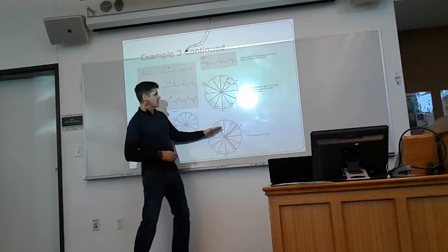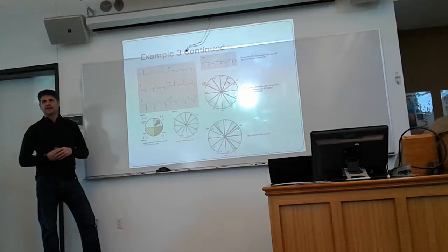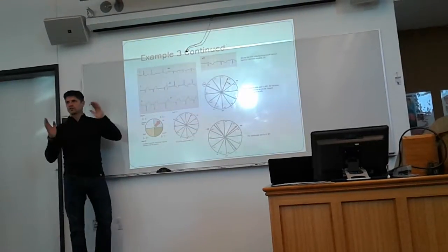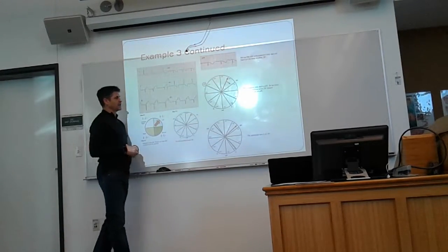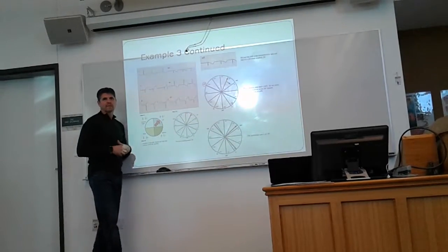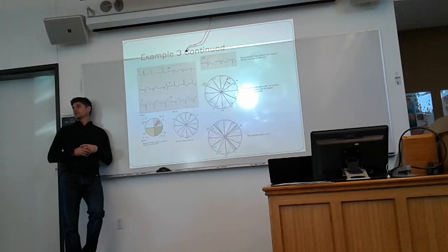Granted, if we start shifting it closer to 20 degrees, we should change which one was biphasic. So we can actually balance between lead 2 and AVR, because those are the two that we went back and forth on the biphasicness, and it's pretty close. Ultimately, it's pretty close to the 15 degree mark between those two. You're only concerned with the proportion of amplitude right now.